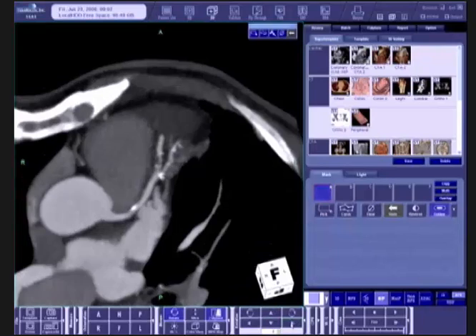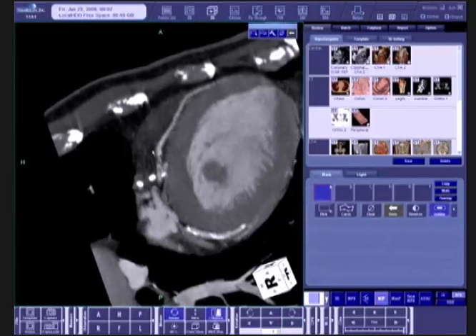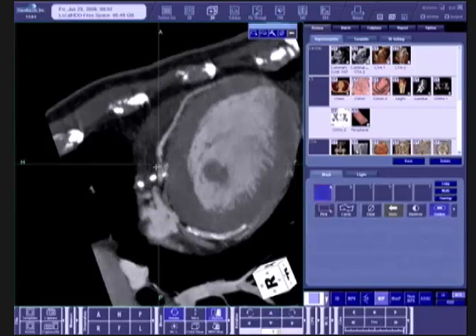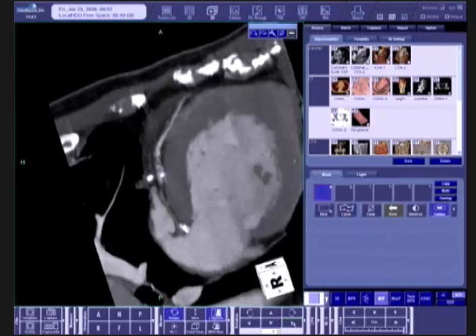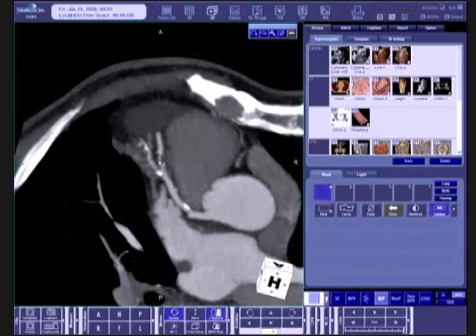So as I move around here, you can see that that lumen is still remaining very ratty in character, and even though it is patent and you can see the vessel beyond the left anterior descending looks normal, this is highly complex plaque, largely soft and potentially unstable. So I would read this actually as a high likelihood of having focal obstructive disease with a soft plaque region.